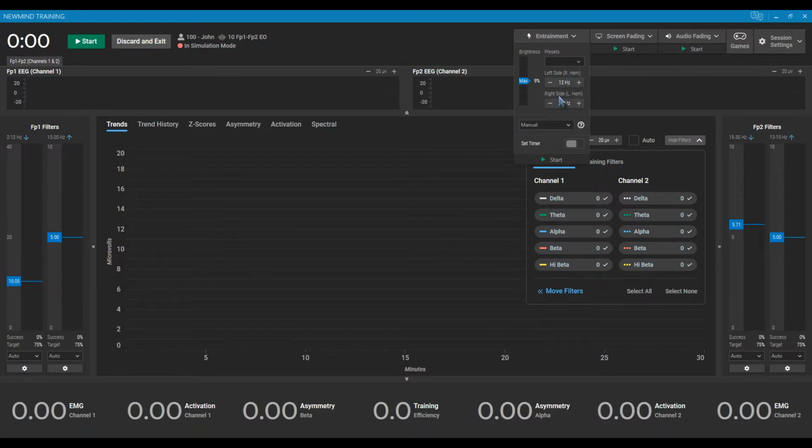Same with the right eye field: it crosses over to the left hemisphere, comes into the back at O1 and stimulates the brain that way. So if you're adjusting the left side, you will be affecting the right hemisphere of your client's brain. If you're adjusting the right side, that's going to be adjusting the left hemisphere. So why would you need to know that? Let's just say you're going to be doing an asymmetry protocol, maybe a protocol 18 or a protocol 20 loaded up.